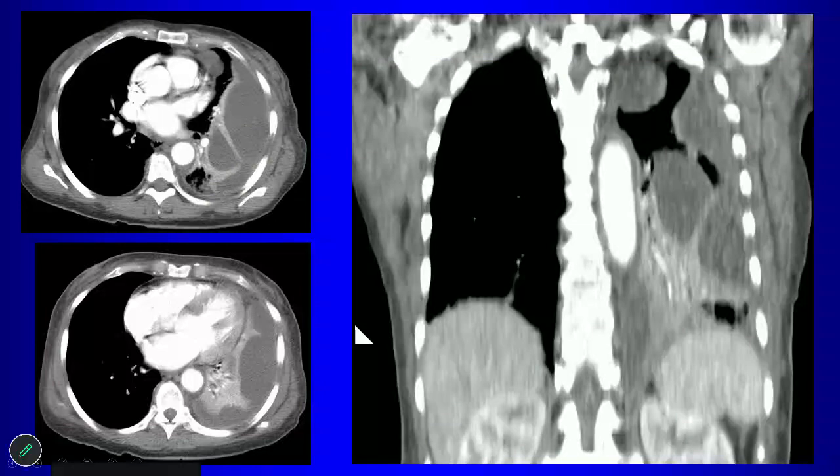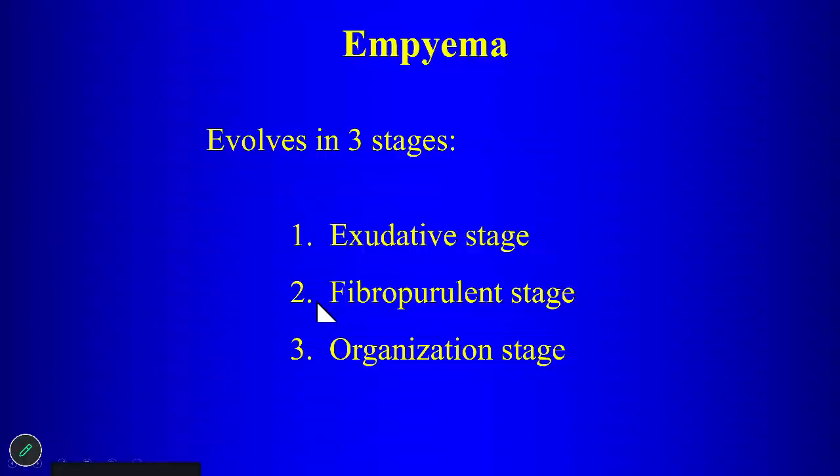So the first thing on your list here might be what? Like a parapneumonic effusion? Well, there's some pleural thickening, though, and there are adhesions. So not just a simple parapneumonic effusion, but empyema, right? So be worried about empyema there.